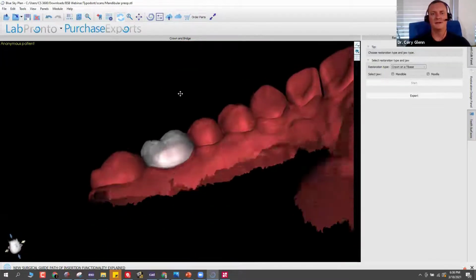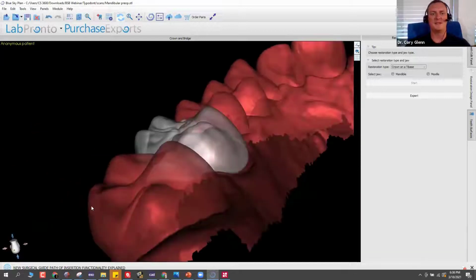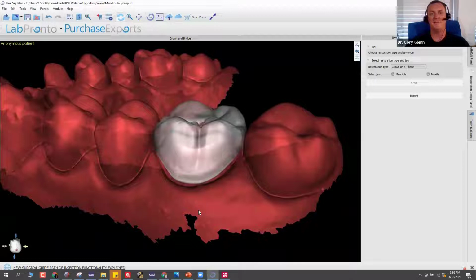But again, super easy. If I hadn't screwed that up and been talking the whole time, I would say on average, it takes me about 5 minutes to design a crown in Blue Sky Plan. And again, that's hard to beat for a free software. So Michael, any questions before I jump into the bridge?